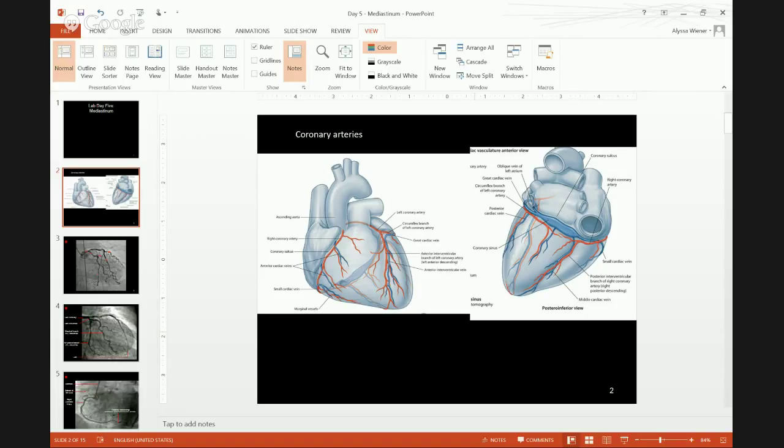4 is this little thing behind the trachea. Here we can see a nice lumen. So 4, I want to call the esophagus. I'm going to just check down here. Yep, 4 is the esophagus.